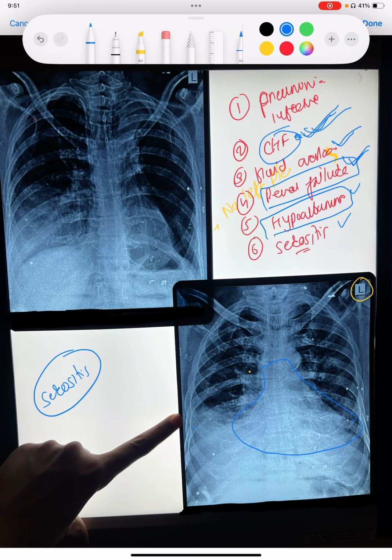So here it is very clear that there is a large consolidation patch with pleural effusion, because this angle is blocked, whereas this angle is completely clean. So this goes in favor of infective, meaning pneumonia with effusion. Whereas here the patient has bilateral pleural effusion, and there is an apparent increased shadow of the heart suggestive of cardiomegaly, which suggests congestive heart failure.